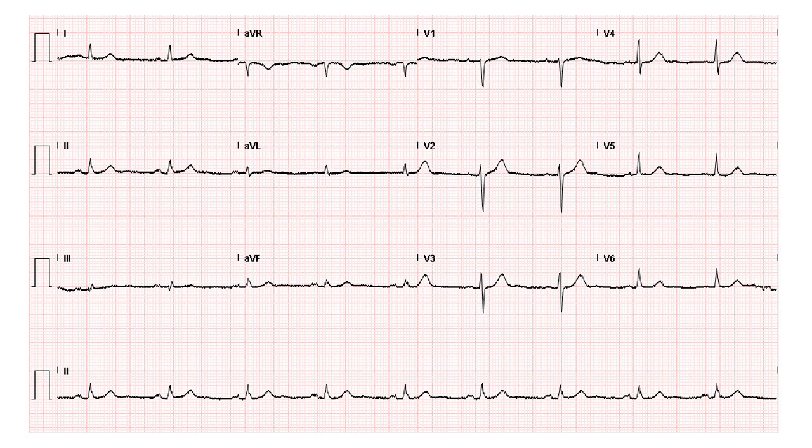And so I'm going to take a look at the QRS complexes and really try and find one where it is the widest in appearance. And so at first glance, I'm going to say the QRS complex in lead V2 appears to be the largest. And so I'm going to measure the QRS complex interval here, which is clearly less than 3 small boxes. So it is normal. So that is less than 120 milliseconds. So I have a normal QRS interval.